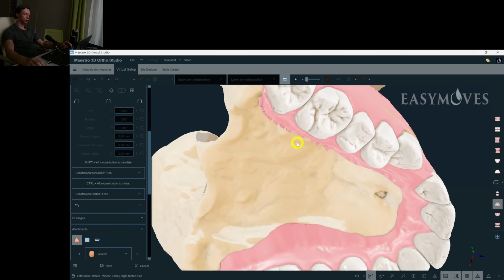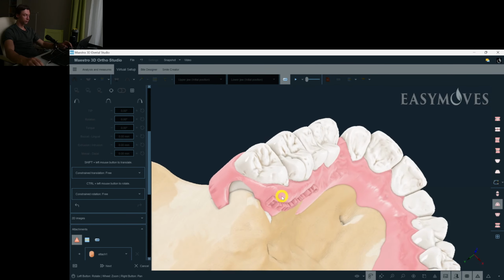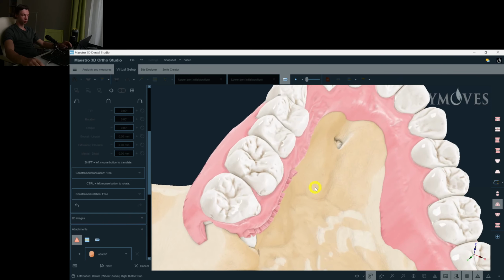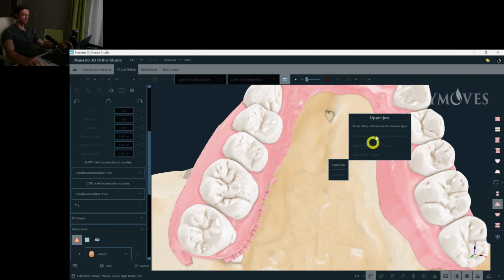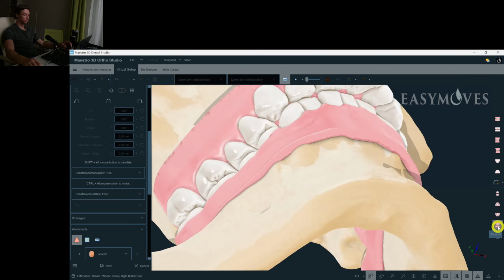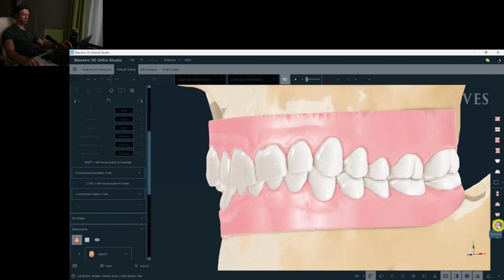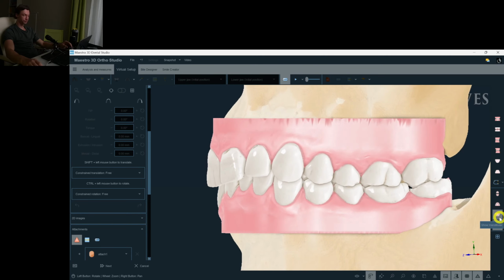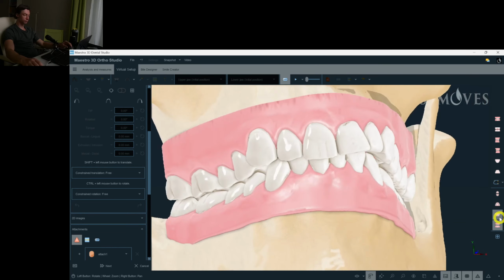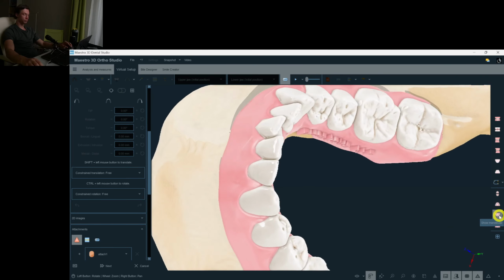There are so many limitations. The bicortical positions of the roots and lack of bone and so on. So that's why we will combine the distalization for about 2 millimeters and mandibular advancement for the same amount of distance. And as usual, we start with some expansion.